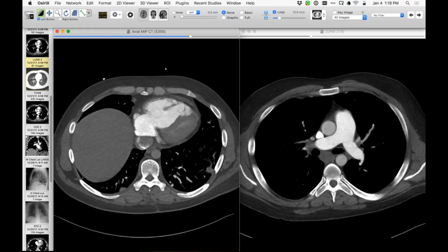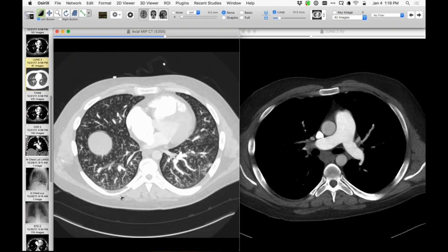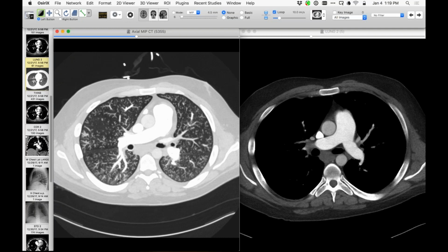It's known to have pulmonary hypertension. The other thing that I was speculating about is whether in the past he had actual pulmonary infarcts, perhaps for another reason. But these are unchanged, but these are relatively large opacities, so I don't know what to make of these down here. But the other findings are pretty dramatic.